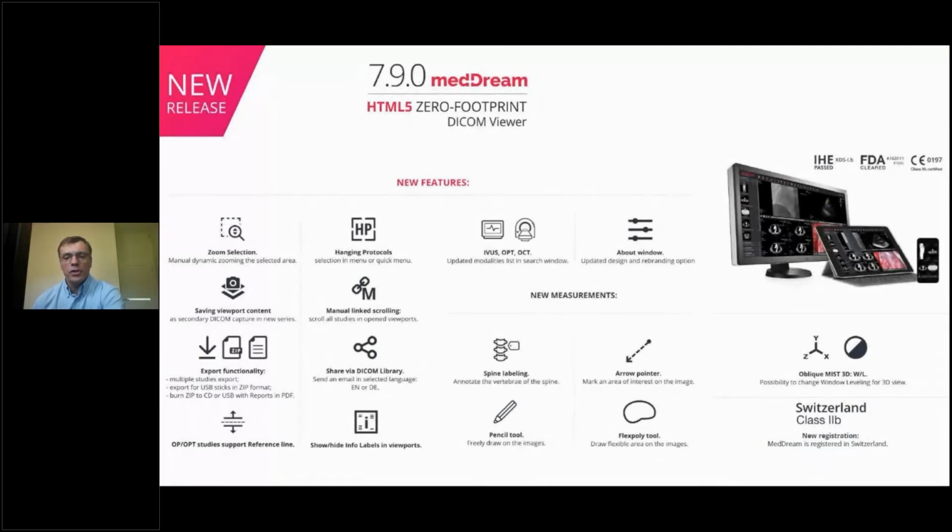So another doctor who connects has all the data in one series, and doesn't need to look over and over through all the studies. Also, new measurements were added, like spine labeling. In the past we had only a comment which you would drag, marking where the point is. Now we added just a marker, so you can mark the point and you don't need to comment.